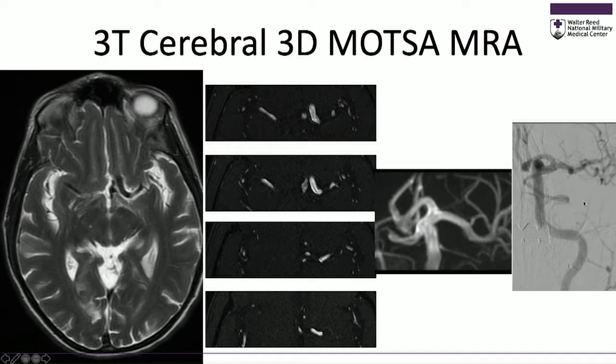The neurosurgeon then took the patient to conventional catheter angiography. One of the concerns or questions they had was whether this would be a good candidate for coiling versus clipping. And you see, both the MIP imaging and the standard 2D planar imaging that we get with DSA both suffer from not having depth information.